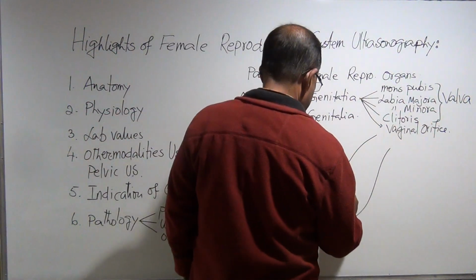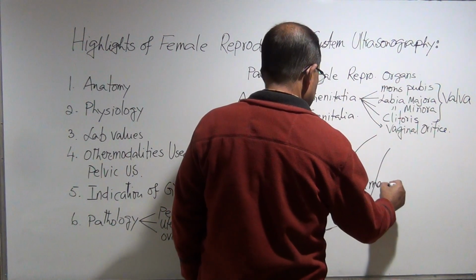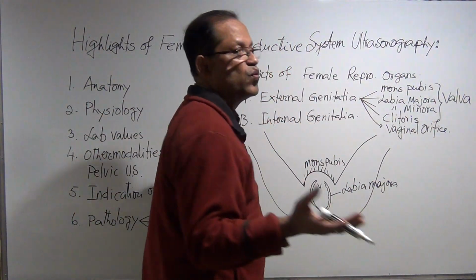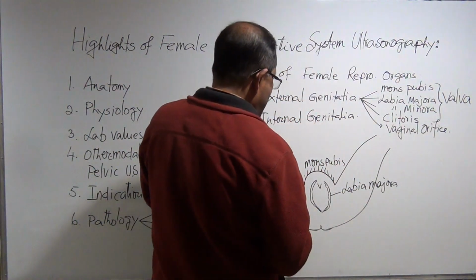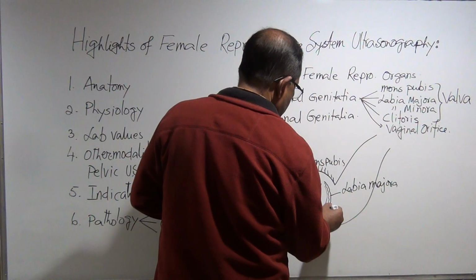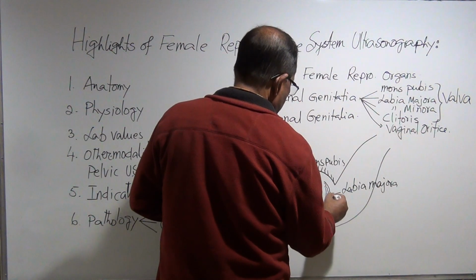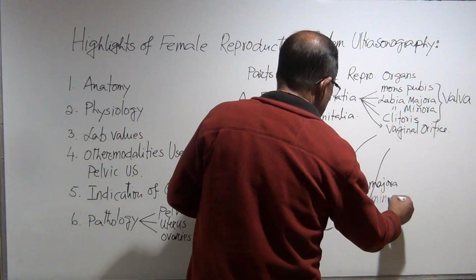This is labia majora. Majora means the major, the bigger labia. Labia means fold. And there is labia minora.